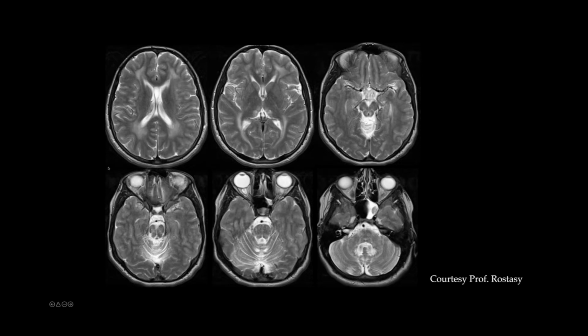We have the T2 axials, and we have these periventricular confluent abnormalities in the bilateral cerebral hemispheres, also involving the middle thalami, the central white matter. The brainstem also demonstrates abnormality. There is cerebellar atrophy, and if you appreciate the dentate nuclei, the hilus of the dentate nucleus demonstrates signal changes, and also the cerebellar white matter is abnormal.